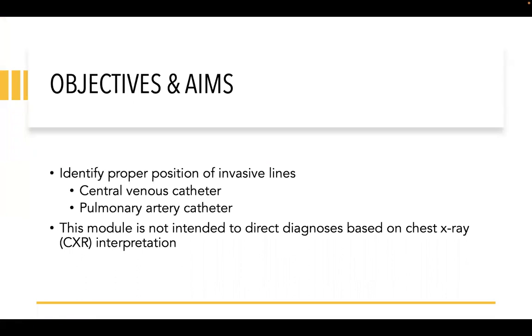The objectives and aims of this module are identifying proper position of invasive lines, including central venous catheters and pulmonary artery catheters. As a reminder, this module is not intended to direct diagnoses based on chest X-ray interpretation.